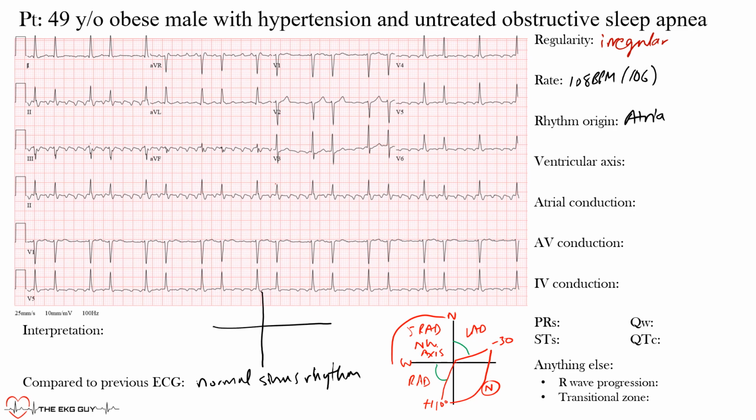A few things I want you to note is that lead 1 sits here and AVF down here. These are sometimes the easiest leads to use to find the axis. Look at 1 and AVF. Notice that 1 is all positive, very positive complexes, meaning that the axis is heading towards lead 1. In AVF, there are a few QRS complexes, one here, one here, one here, and one here. It's hard to tell where that is. It's almost isoelectric, and you have waves that obscure the complexes that are formed. So another lead to look at to help clarify things is lead 2.